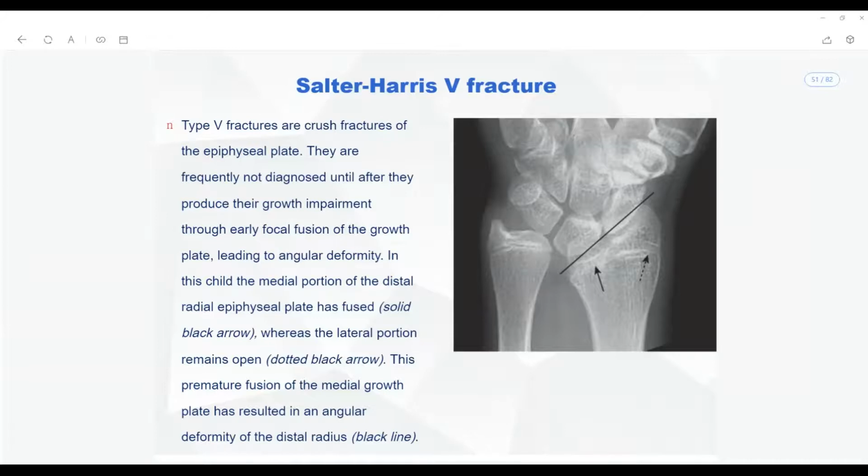So now here, we can see that there will be a median nerve problem as well, right? But you can also see that there will be ulnar nerve entrapment also because of the angular deformity. Did you understand now what the difference is? The nerve that is not involved in the carpal tunnel is the ulnar nerve, and the median nerve is also involved within the carpal tunnel.